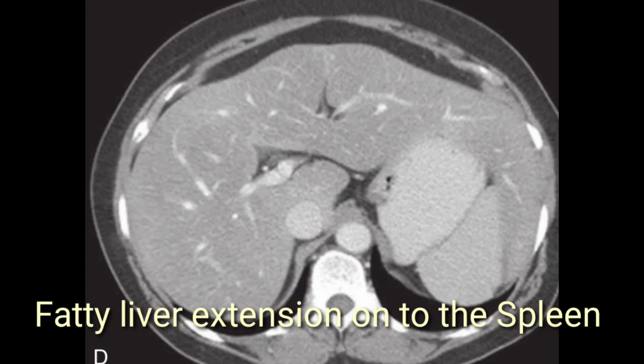The liver appears hypodense on the image due to fatty deposition. The large left lobe is protruding into the left hypochondrium, and it is clearly seen that the liver lobe is covering the superior and lateral margin of the spleen. It's hepatic steatosis with hepatomegaly.